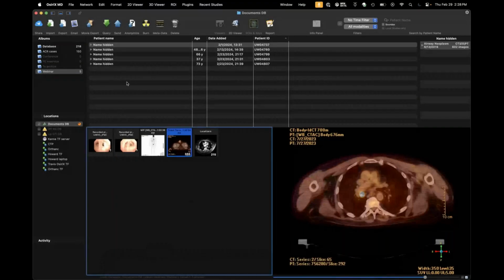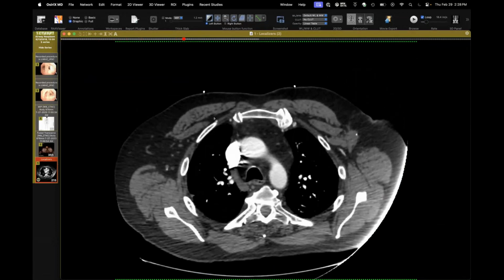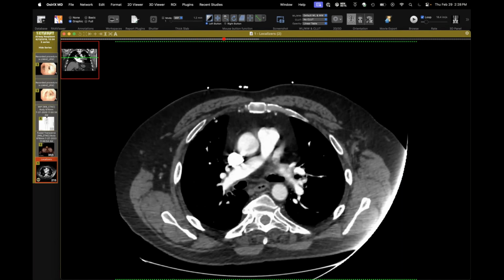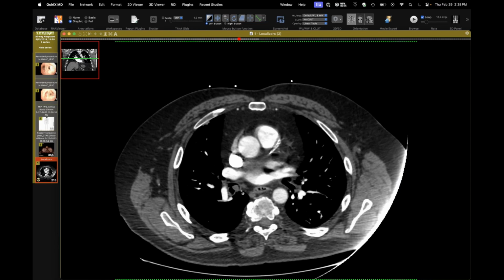Okay. So I've got 2 cases with the same diagnosis. These are some interesting ones. I'll start with this patient, who had a history of a spindle cell melanoma, which is a variant of melanoma that has these spindle cells. On surveillance imaging, they noted a new nodule at the bifurcation of the bronchus intermedius.